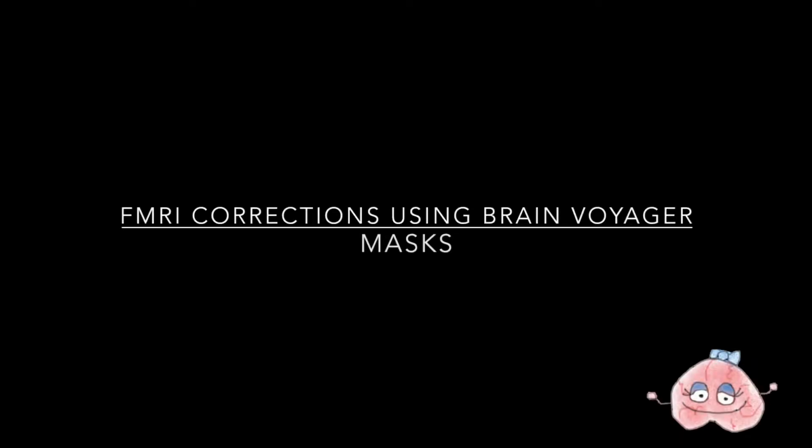A more formal approach to removing activation outside of the brain is by applying a mask. The mask will dictate which voxels will be considered in your analyses. Think of it as a process that creates a border around the area of interest and negates any voxels outside this area. Now we're going to take a look at the effect of a mask on BrainVoyager. Don't worry about following the steps. Rather, focus on understanding the role of a mask and how, in our case, it removes voxels outside of the brain.